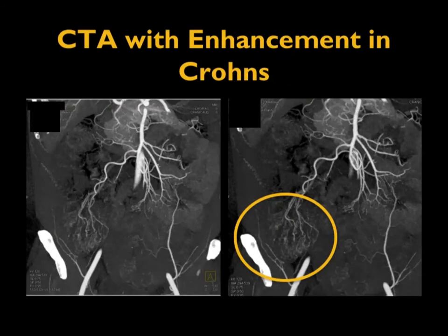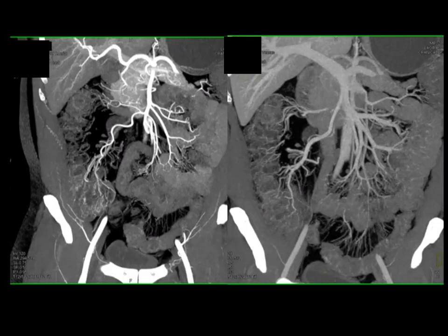Or in this example, again, Crohn's, abdominal pain, look at the prominent vessels, the branches off the ileocolic, right lower quadrant, very, very nicely seen there and here, showing this patient has active disease. Again, bone removal and then MIP imaging worked very well in this case.